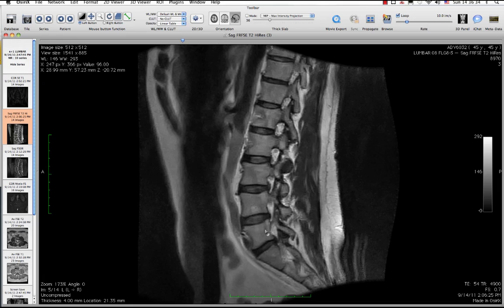So if you look at the cursor here, this is the 5th lumbar vertebrae. This is the 4th, 3rd, 2nd, and 1st. This space in between these lighter bone areas are the discs. This area down in here is 1st sacral vertebrae, 2nd, 3rd, like that. Now these are fused on some people and not on others. You'll see on mine there's pretty good discs in there.